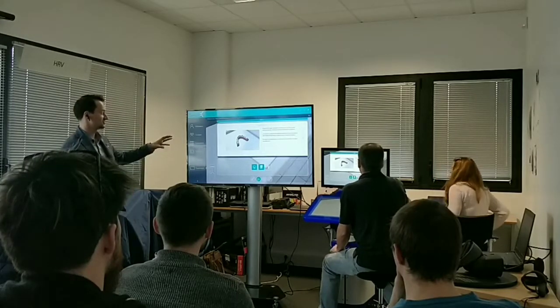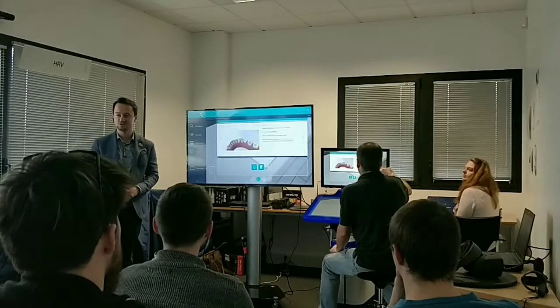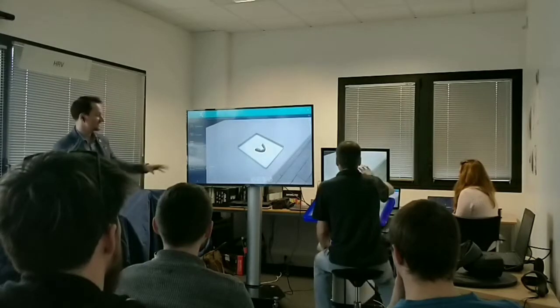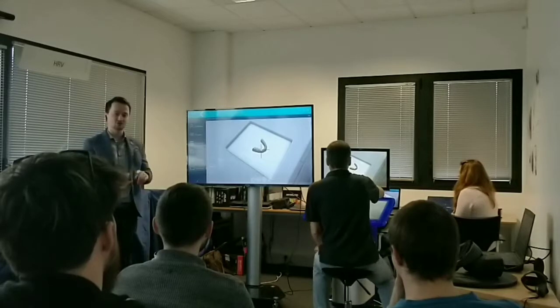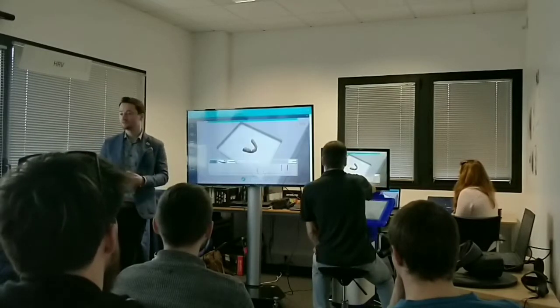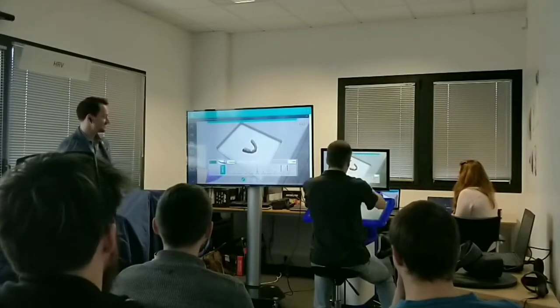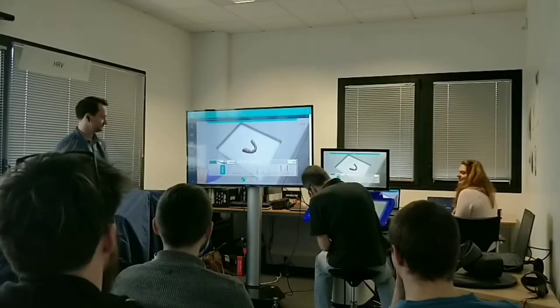So these are the instructions for the lesson, which the teachers can modify for every single one. And afterwards, we can select a burr, and we have a selection of slow speed, high speed, and we obviously have the pro. And these can be modified for all of the universities so that it matches what they have in the real clinic perfectly.